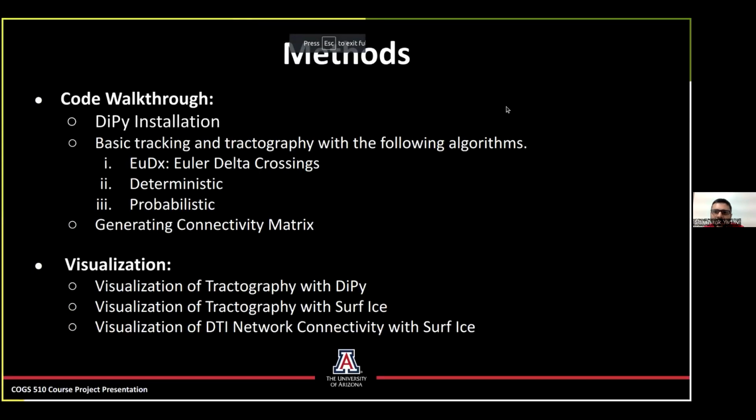So we are done with the first part where we just go through the code, and I'll show you some results. But right now we are interested in visualization. So first I'll show you how to do it with DiPy and then go with Surf Ice. And the last one would be visualization of DTI network connectivity with Surf Ice.